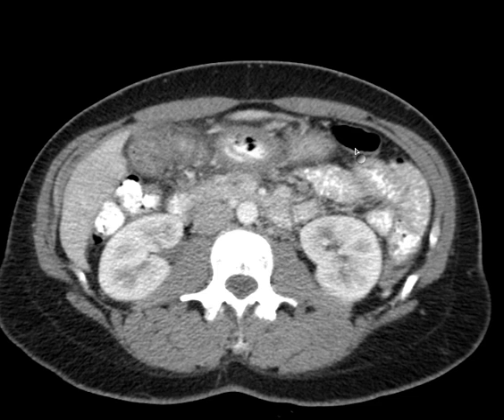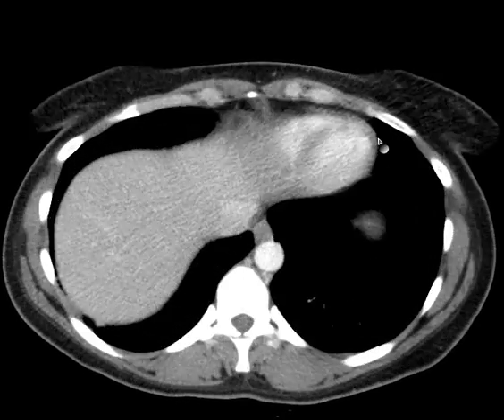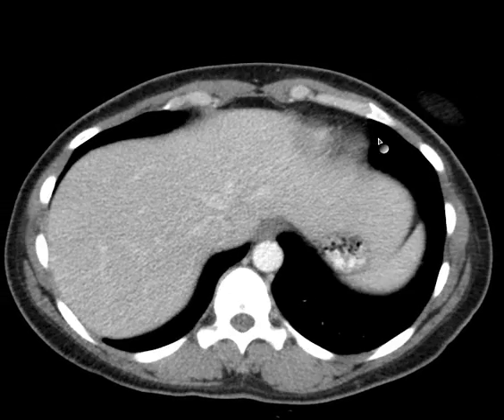So you'll hear that again and again, and it's the way I see this information, a large part of the program, being relevant to your professional future. That said, let's take a look at this CT abdomen and pelvis.